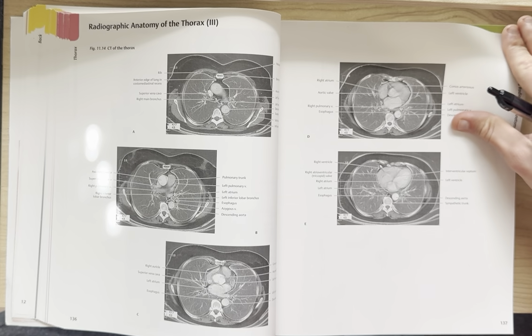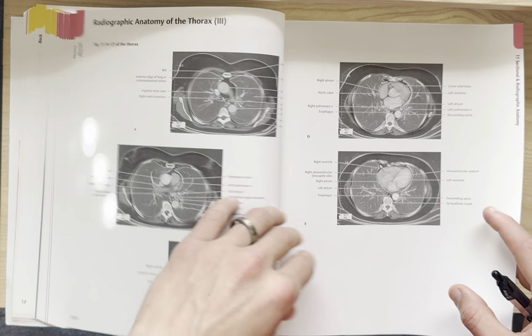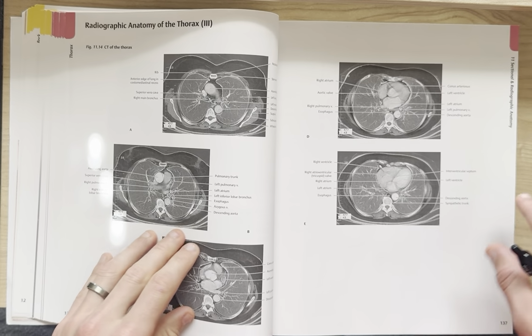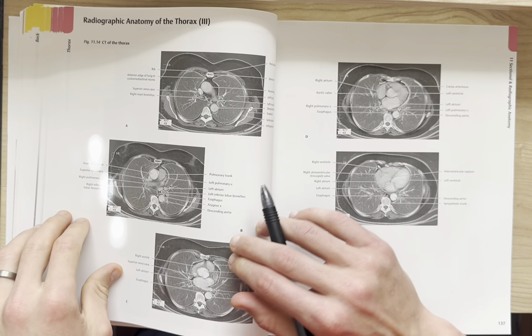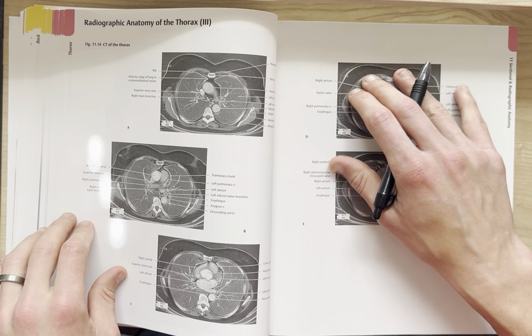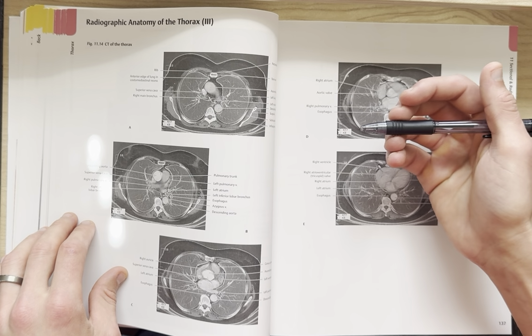And then, let's see, we've got one last set of images here. So we'll look at this CT of the thorax. What's noteworthy with the CT is I already kind of explained very basically the idea of the MRI, but the CT stands for computerized tomography.